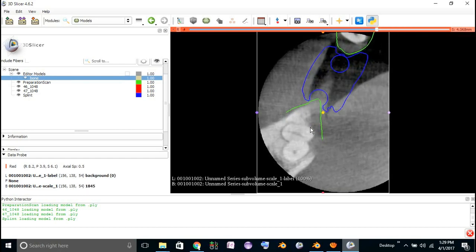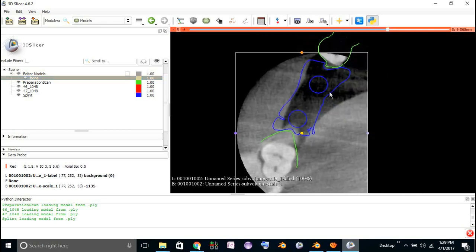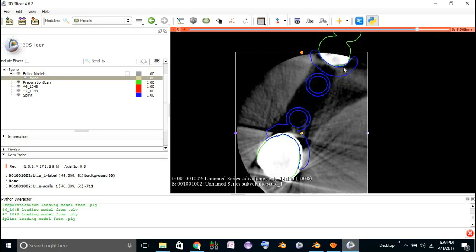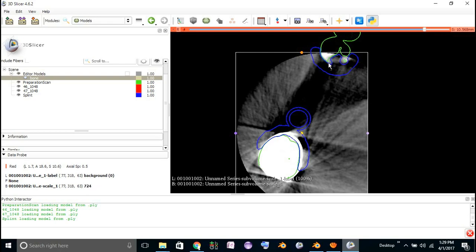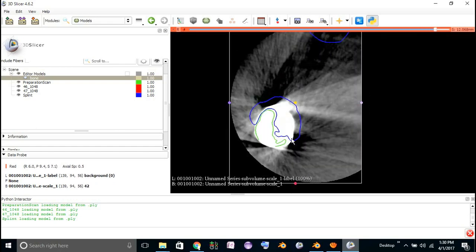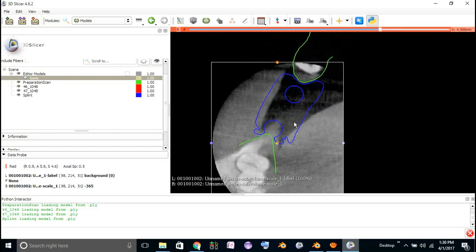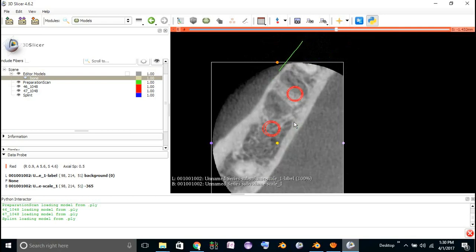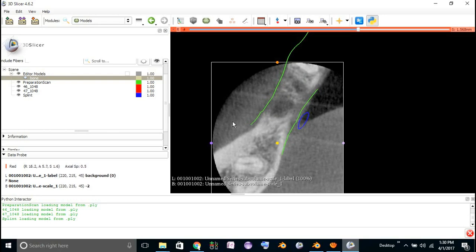Okay, it doesn't look too bad. Especially there. That looks like we've done a pretty good job. It's really hard to read with the metal artifacts. But we're certainly not far enough off that it's going to matter clinically at this point. What you really want to make sure is that you don't have any major deviations, in one direction or another.